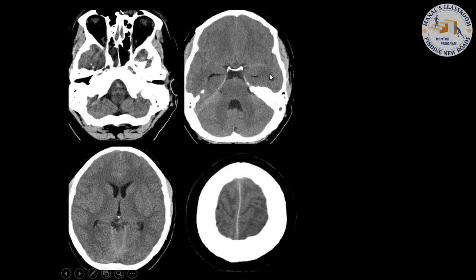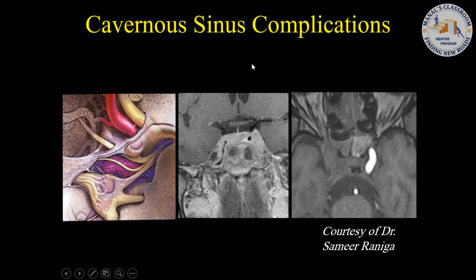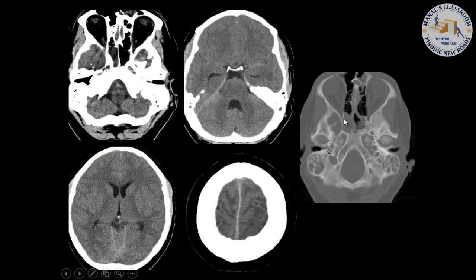He went into septic shock. And when you go back and look at this case, on the bone algorithms, notice there's complete opacification here of the sphenoid sinus, and it probably was here before, but the only way that we could put this together was that it's possible this child, as in the case I showed before, ended up having a mucocele involving the sphenoid sinus, was symptomatic, and at this point they probably should have gotten a contrast-enhanced CT, because my sense is that there probably was a meningitis, and this is what caused the dilatation of the temporal horns, and unfortunately the child expired later.